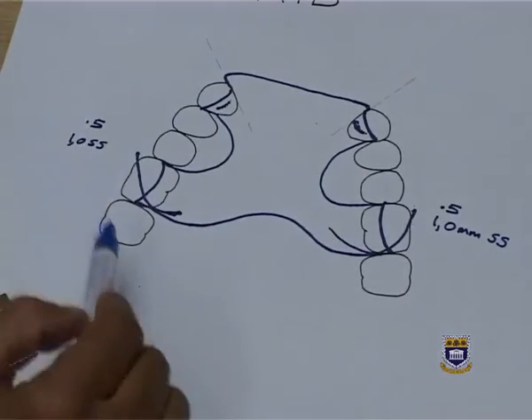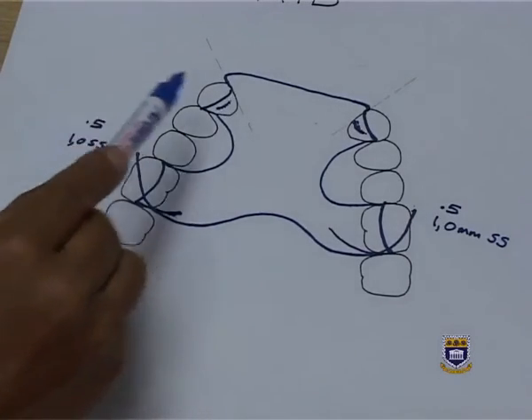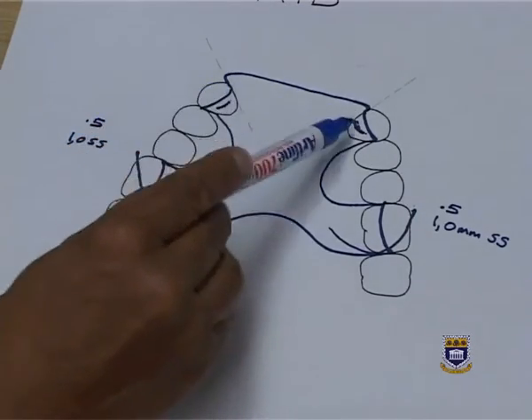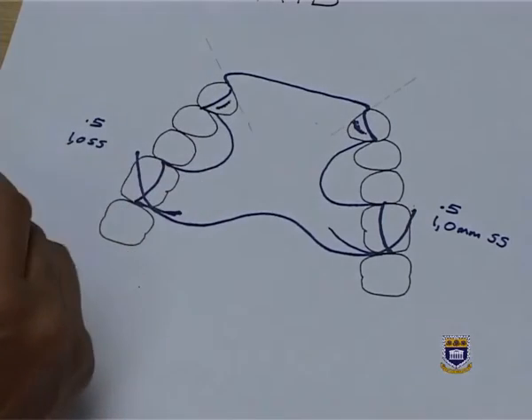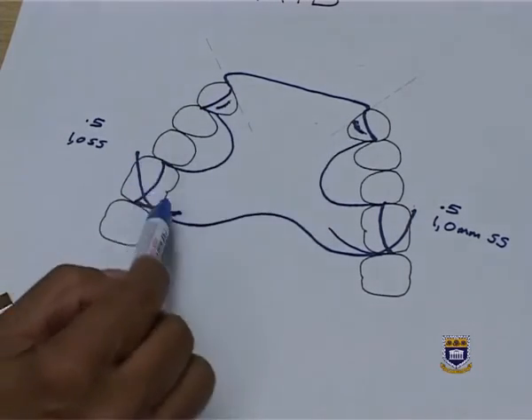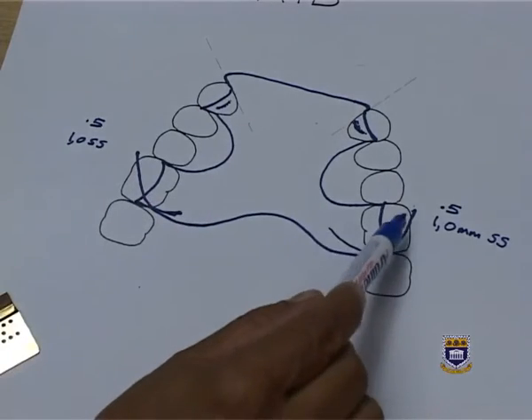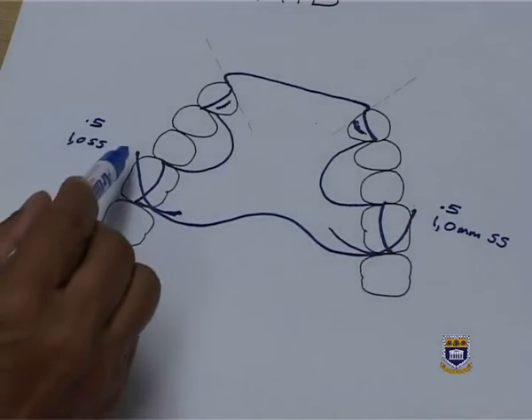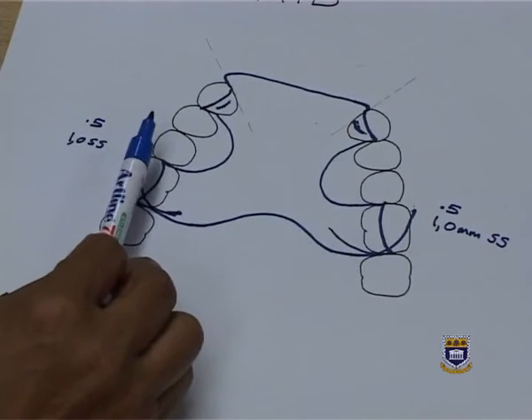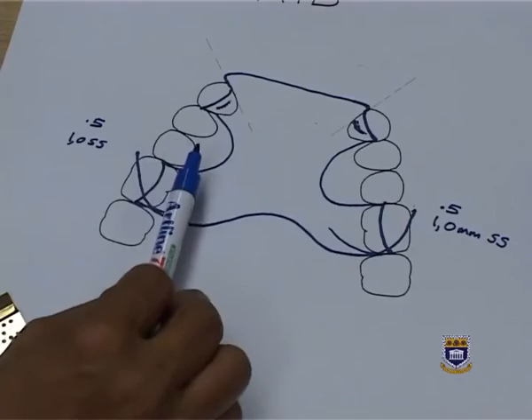So finally, when I look at it again, I'm looking at whether I've got guide planes. I've drawn my denture in contact with my teeth, my abutments. Do I have my 3 rests, 1, 2, and 2 embrasure rests? I've got active retainers, a minimum of 2, and remember it must be 1 in each quadrant.